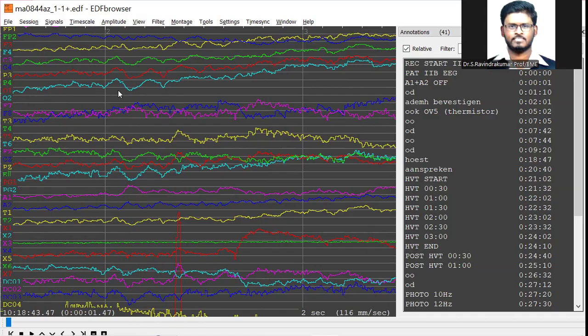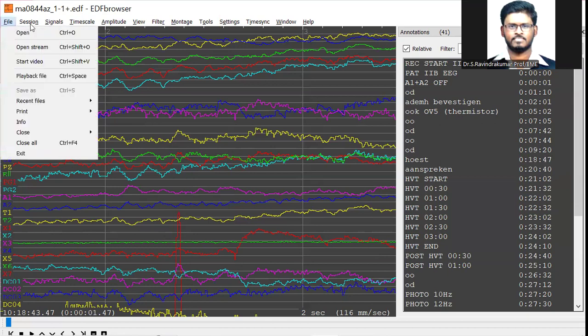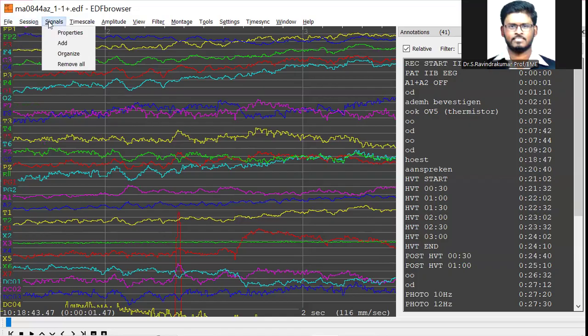So manually, if the student or the scholar or the product designer is interested in only one particular signal or only this much time period, you can take that time period alone, convert it into a CSV file, and those signals can be analyzed using MATLAB.